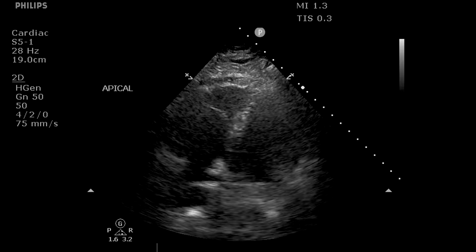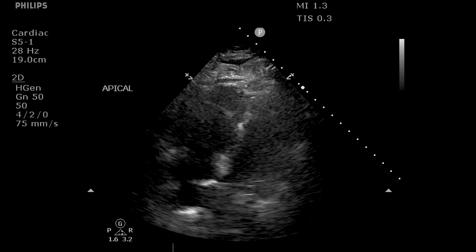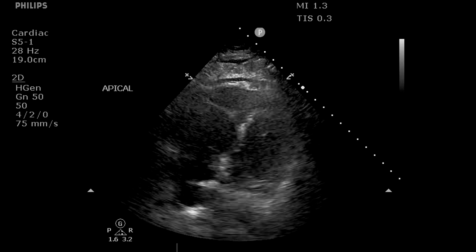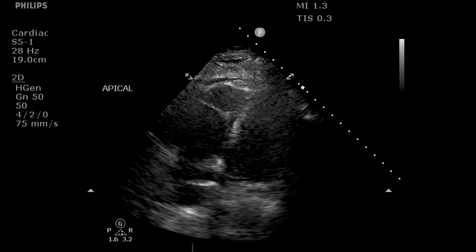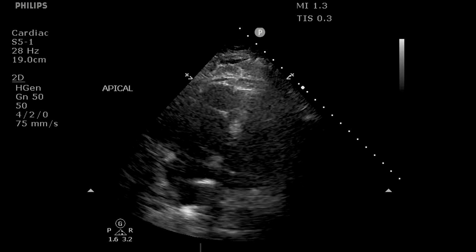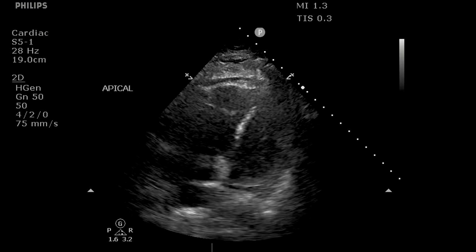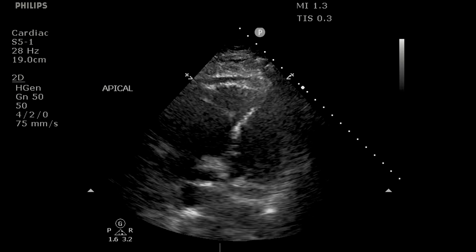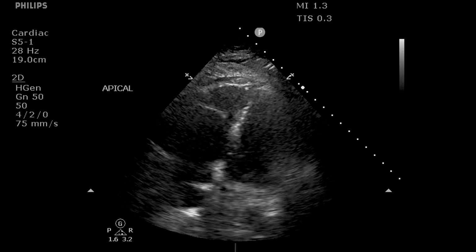And so what you'll see in these hyperdynamic patients, right, the patients that have a really super duper high ejection fraction, is that the walls will get really close to each other. What we call kissing ventricles, where you have the walls kind of squeezing every ounce of blood out. I was trying to look through my archive and I didn't find one, but a classic example that I've seen a number of times is a GSW that's hypovolemic, right? The patient's bleeding out somewhere.